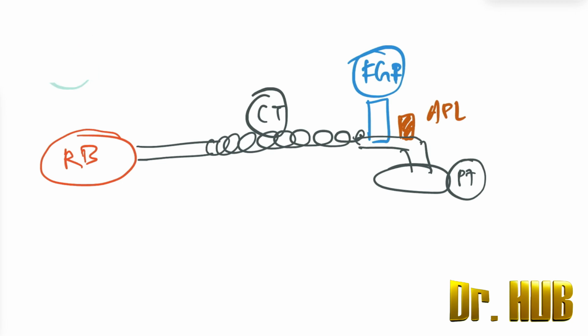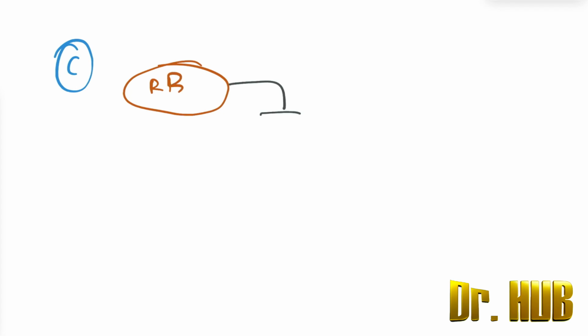Next, we move on to the Mapleson C. Mapleson C is very small, so we need to know it. There is a reservoir bag. There are no corrugated tubes here, so there is just the patient mask, and the FGF. It's similar to B, so you just remove the corrugated tubes. Next there is an APL. So this was about type C.